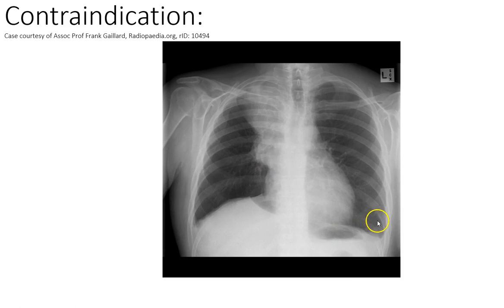The heart. So this is relatively crisp and clear. The heart, it's a little bit of a bigger heart, although actually, no, when I look closer, it's only a half. Again, right positioning. The trachea down to the two main bronchus, yep, no problem, and it's fairly central. Maybe a little bit kinky, but it only follows the track of the spinal column, so I'm not too worried.